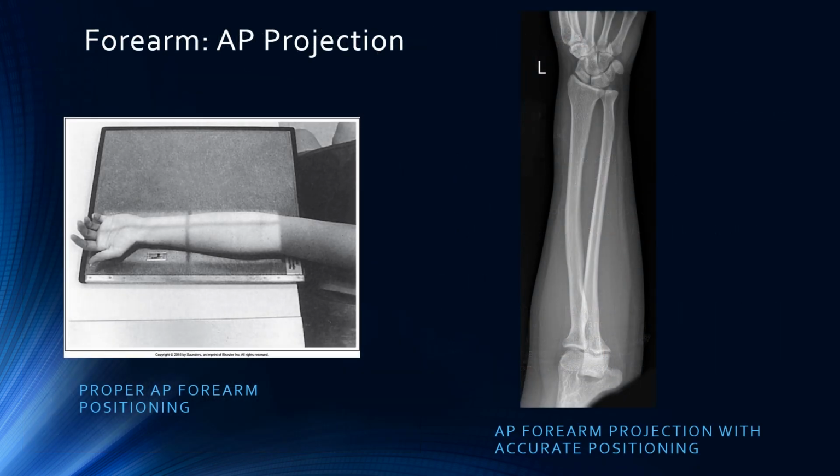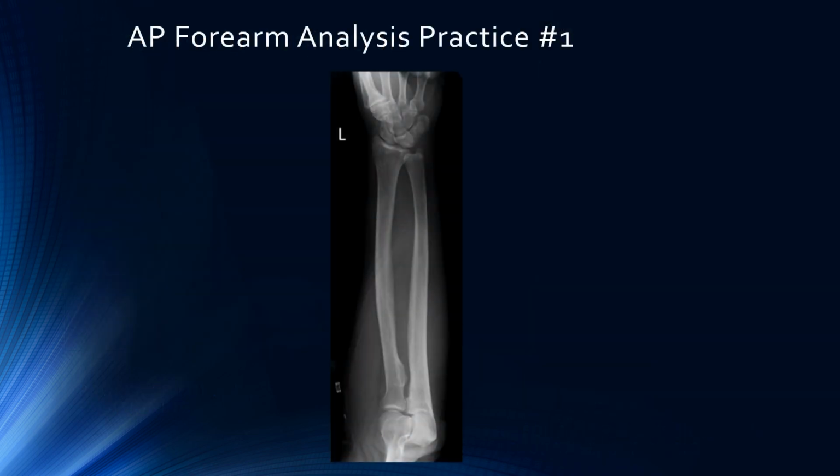Forearm, AP projection. Here's a proper positioning of a forearm with accurate positioning. You want to center mid forearm. AP forearm analysis practice number 1.